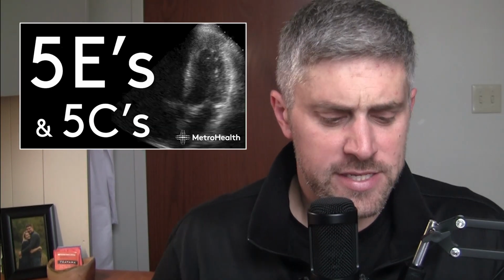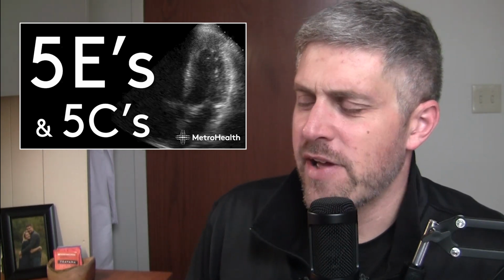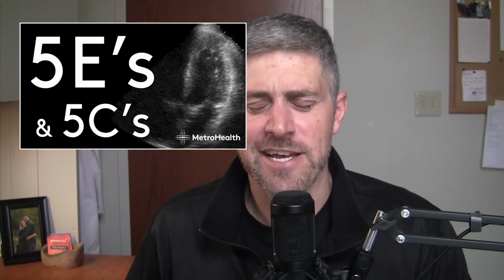But today we're going to come back to some more ultrasound stuff, and specifically cardiac ultrasound. Last week, if you remember, we talked about the 5 E's and the 5 C's. We had this lecture talking about the 5 E's of echocardiography, and we viewed that in the context of 5 specific cases. One of the comments that I got back in the open comment section, which we don't publish on the YouTube channel, was, hey, this is all well and good, but I'm struggling to keep up with what window is what window and how do I put the basic pieces together?